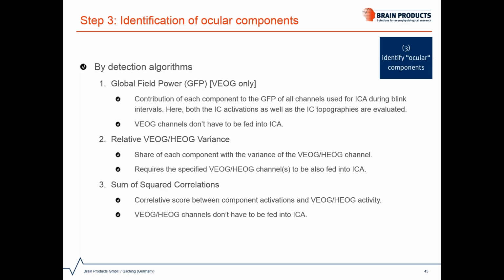This threshold might though need some adaptation, so what you enter here is rather arbitrary. If you have a lot of rather weak components, a lot of them might be pre-marked, while if you have a very strong component, maybe just one will be marked. So in any case, we would still say use your expert eye and visually inspect the data.